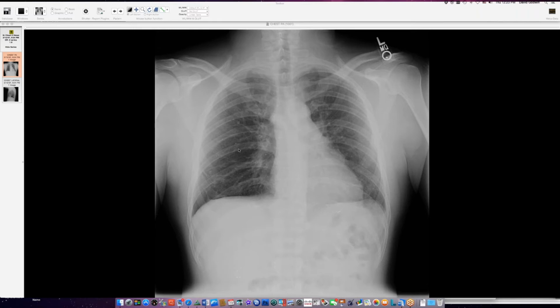And I'd shown a case like this a year ago, a different person. And this was not tumbled to by the radiologist who interpreted this or the other exam. We don't have a CT scan to go along with this. We only have 2 chest radiographs, and they both show these fine metallic particles in the same distribution. So people can get high from injecting the metallic mercury. Probably when it hits the lungs, it releases some cytokines, and they get a kind of rush. I don't know whether you guys have seen this at your institutions. I did show a case a year ago. So heavy metals, dude, heavy.